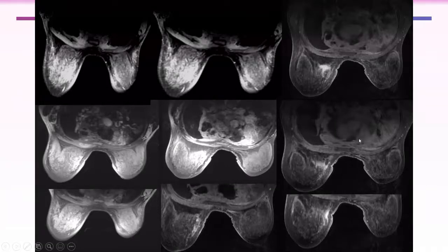Usually you have seen what behind the breast? Heart. Is it a normal heart? And surrounding the heart? The pericardium is thickened also. Thickened and heterogeneously enhanced pericardium, as well as left pleura. Yes. You see, here there is mild pleural thickening on the right, while extensive on the left side.